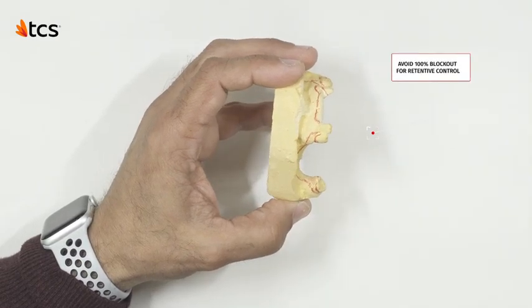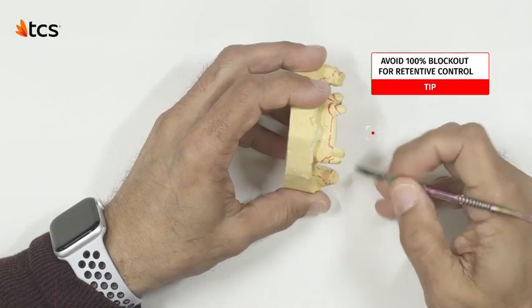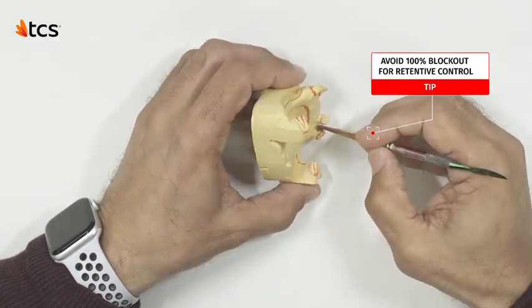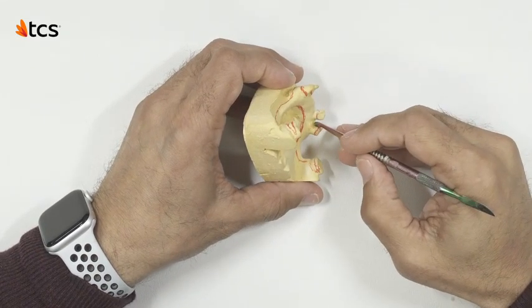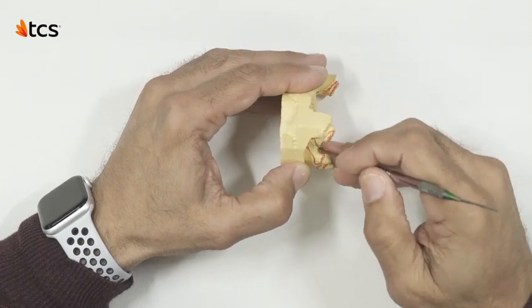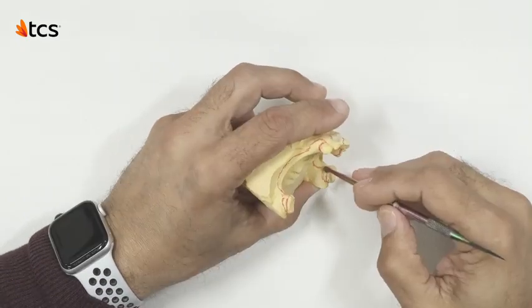Although blocking out allows for a faster fitting time, it is advised to avoid blocking out 100% in order to retain retentive control in the fitting stage. We proceed to blocking out the undercuts all throughout the case, staying closer to a 90% blockout to manage the retention needed.